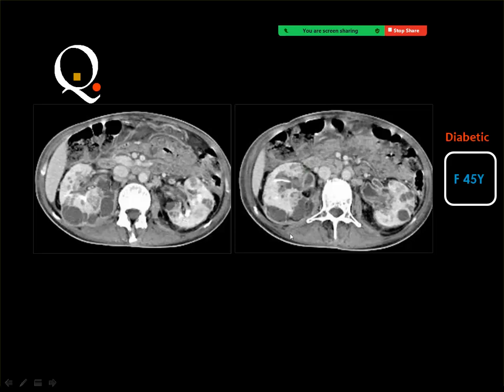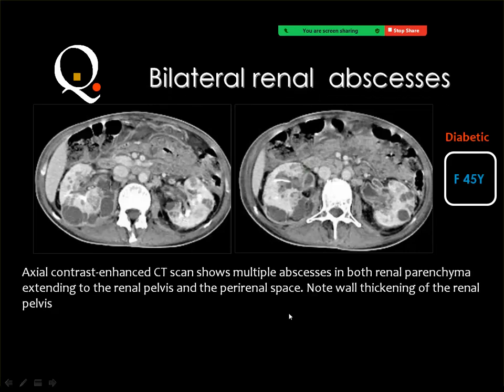The kidney is enlarged, and most of the kidney may be replaced by fat, and there should be a big stone in the renal pelvis. These are missing here. The criteria of xanthogranulomatous pyelonephritis are not seen in this case, but the right answer is bilateral renal, nephric, and perinephric abscesses involving as well the collecting system.